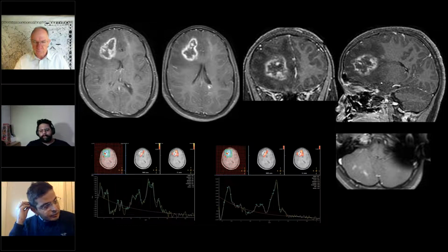Except that the few infections, particularly TB, we saw from South America as well, and from some of the centers in Mumbai, particularly with our initial COVID collection. Yeah, the TB was presenting in a very malignant fashion, very aggressively, as you can see here, lots of tumefactive kind of process going on.